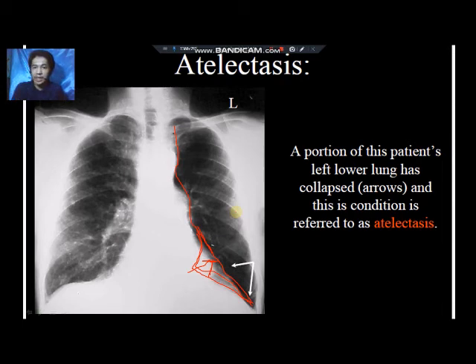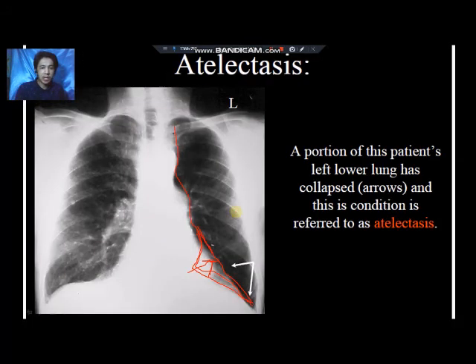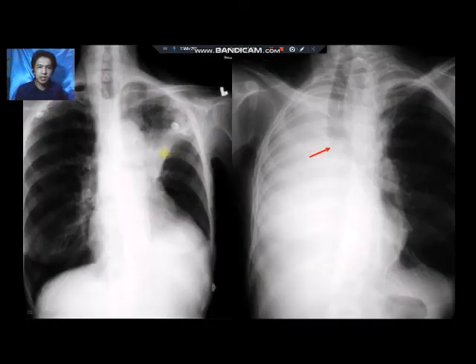Okay, so again, this is atelectasis na nag-collapse ang part sa lungs ni patient. Pwede nga partial, no? The part of the superior lobe sa left lung ni patient is nag-collapse. So munang ang inferior lobe ni patient is nabira pasaka. Okay, so portion na siya, di ba? That means atelectasis is only a portion of the lung fields the patient is nag-collapse, but then the inferior lobe is naapektuhan po siya, nabira siya, di ba?